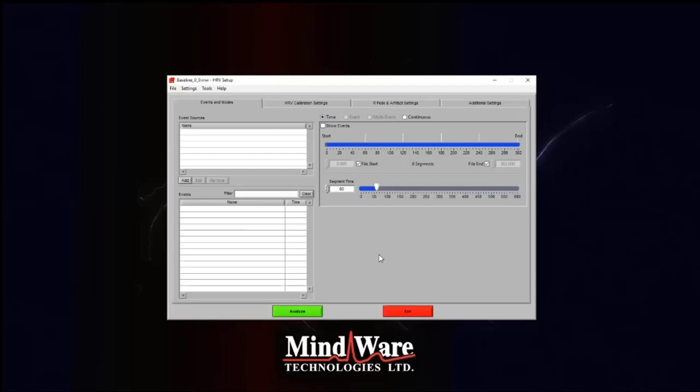If you're not comfortable with that, there's a very easy way to standardize it in these cases: just uncheck that file end or file start, whatever 300 seconds in this case that we wanted, because again, this is that baseline information. So we could simply pick baseline being 180 seconds. We can choose any 180 seconds within here. So I'm going to go ahead and just choose the first 3 minutes, so we can type that in. And then as soon as we go in and actually do the analysis, we'll see that we only have the 3 minutes and we're going to automatically exclude the rest of the information.